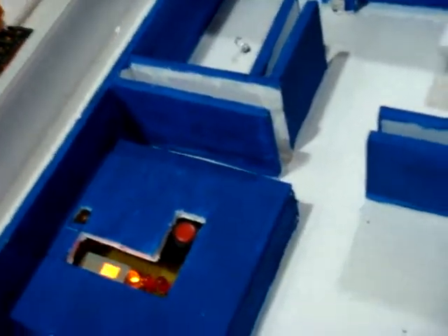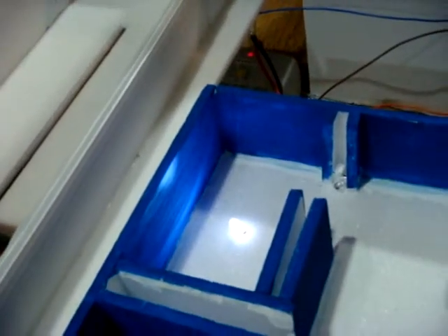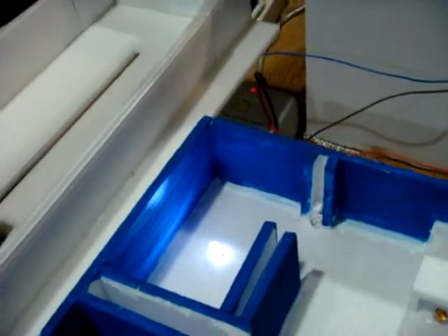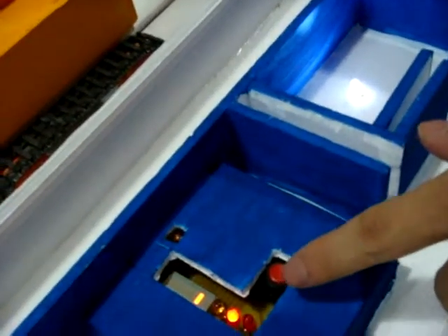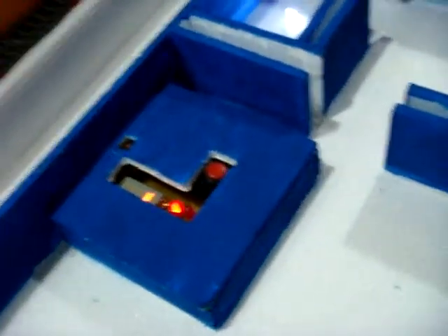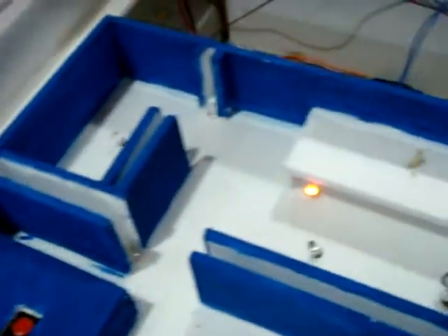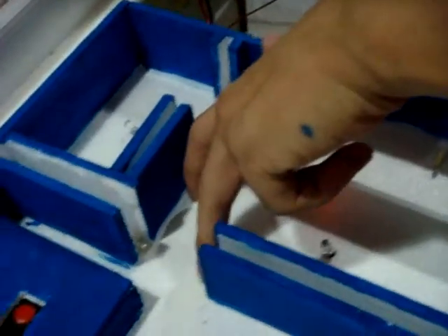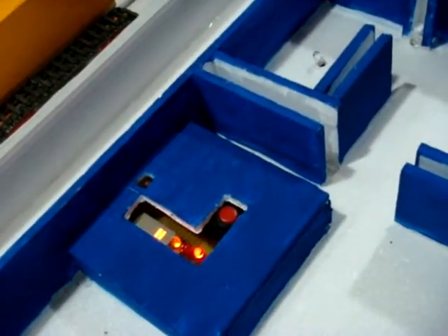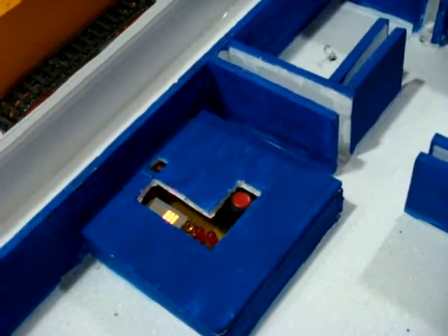When the patient enters the toilet, the floor light will be switched off and the toilet light will be switched on. If the patient is in the toilet for an extended period of time, a warning will be given to tell the nurse to check on the patient. Upon checking, she will manually reset the system. If the patient exits the ward, there will be an immediate warning telling the nurse. Same thing, it will be manually reset.